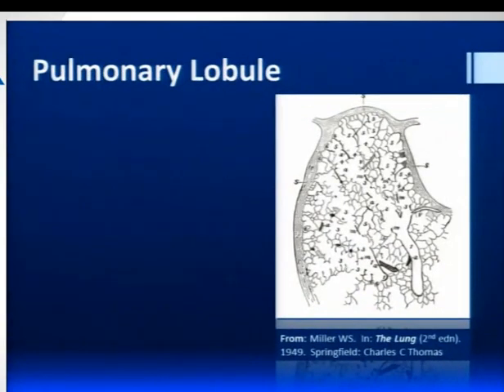Now, those of you who've been to a number of the lung lectures will probably have become a bit sick of the description of the pulmonary lobule, or the secondary pulmonary lobule, as it's called. I have no idea what the primary lobule is, but here it is. This is the secondary pulmonary lobule.